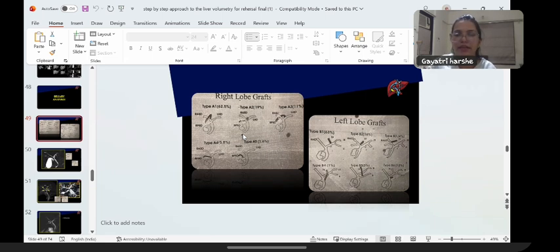And that particular duct will get dilated. You will not have proper biliary drainage of segment 4A and B. So that's why this is a crossover case, and for a right lobe graft, it is not taken. If it is a left lateral resection, then it will be taken, because in left lateral resection only segments 2 and 3 are resected. So that doesn't come with segment 4.